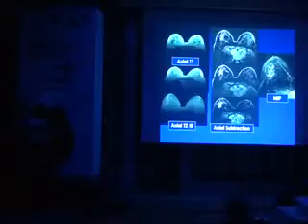Differential diagnosis. Usually, the first differential diagnosis that we all should keep in mind, especially if it is just asymmetry, meaning the other breast is totally normal, we should definitely think of DCIS. But not all cases are really DCIS.